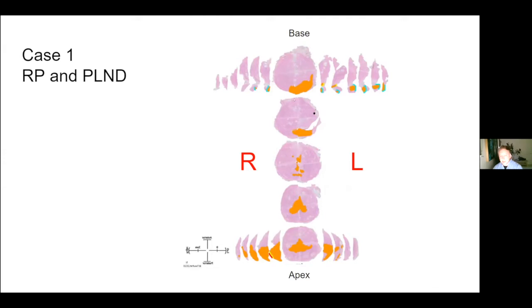So you can see quite a large volume tumour, certainly involving the peripheral zone or the posterior aspect of the prostate up towards the base. It has got a more central distribution in these lower 2 transverse sections, but certainly involving the peripheral zone in these apical sections where this is posterior and this is anterior.